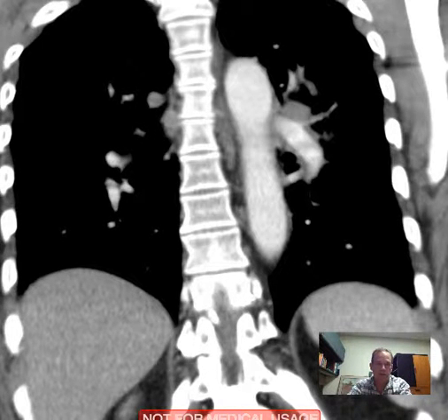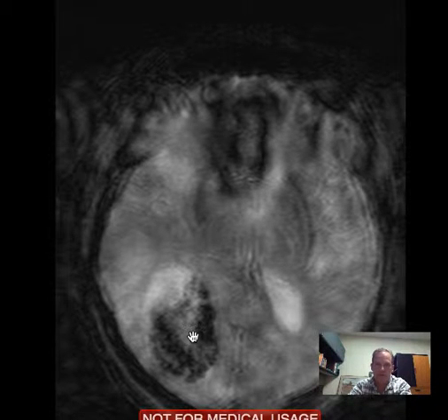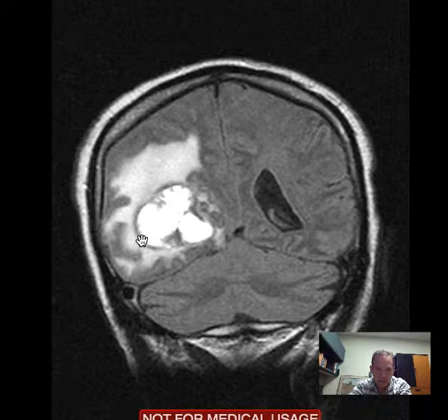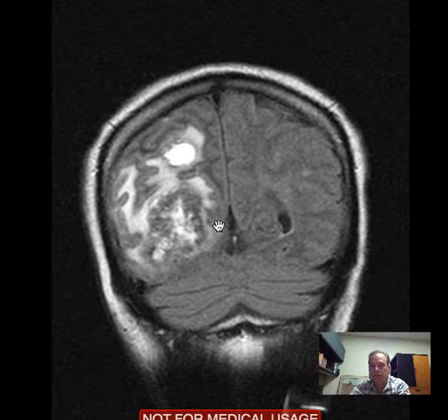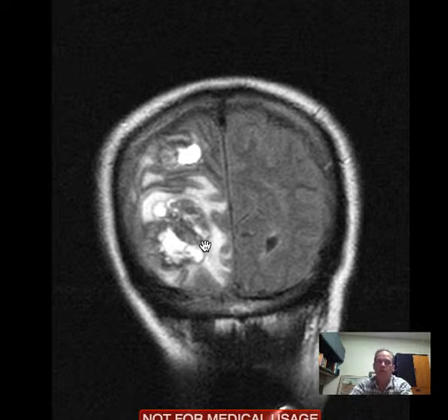Let's look at the subsequent imaging study of the brain, an MRI brain. And here you can see this dark signal on this particular GRE study, which is typical of hemorrhage. So anytime there's hemorrhage, it's usually low signal on GRE. I'm not going to ask you that, but just to expand your horizons a little bit. This is a coronal image showing you very clearly the mass itself, and additionally the significant surrounding brain edema. It's called vasogenic edema. That's the general type of edema that accompanies tumors.